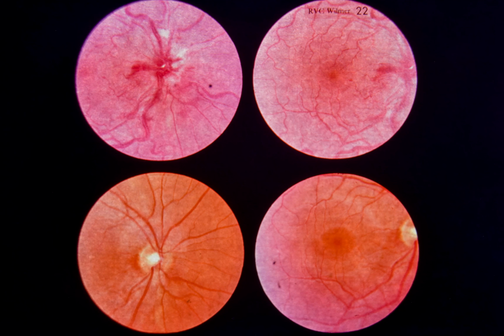Upper right. The macula has several small parafoveal hemorrhages and moderate vascular tortuosity. A systemic evaluation was normal, and no treatment was recommended. The patient's visual symptoms disappeared over the next 6 weeks. Lower left and lower right. 2 months later, the right optic disc, macula, and retinal vessels are normal.